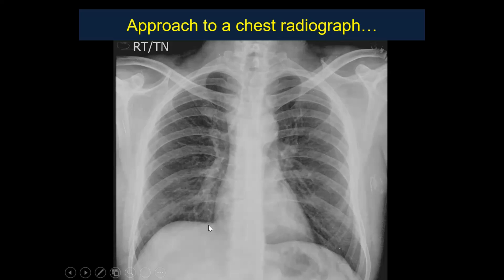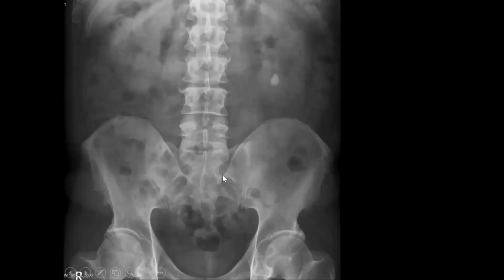This is a normal radiograph, and it is important to carefully look at the margin of the heart, which should be normally seen. Measure the inner to inner dimension of the chest, and the cardiac dimension should not be more than half of this distance. So this is a rough estimate of absence of cardiomegaly. So this is important to have a basic evaluation on radiograph chest.